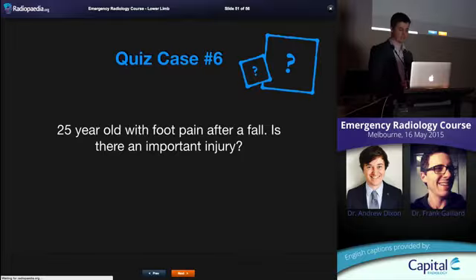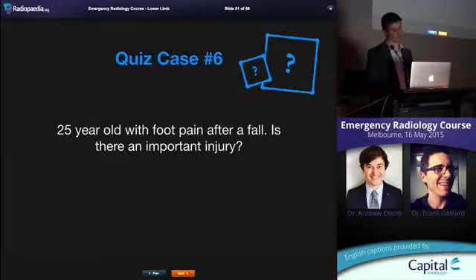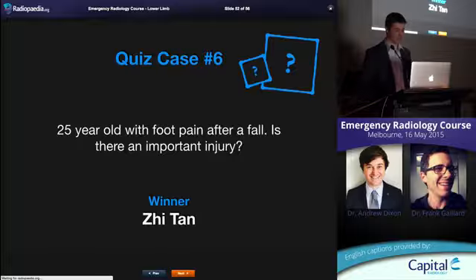All right, quiz case number 6. 25-year-old with foot pain after a fall. Is there an important injury? It'd be great if the answer was no, but of course the answer is going to be yes, and trying to find what it is. Here's our winner, Z Tan. Do you want to come down?